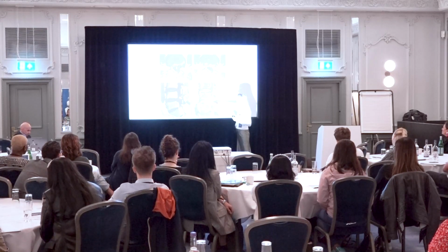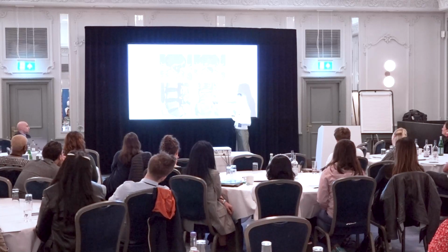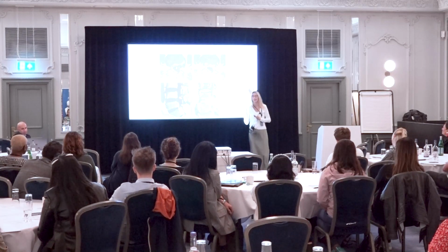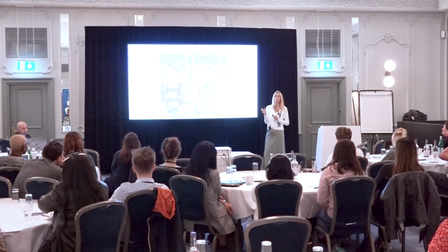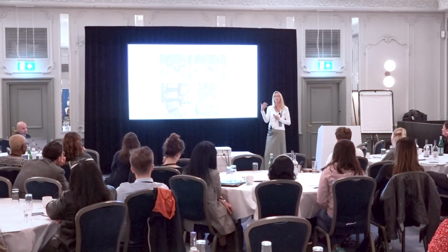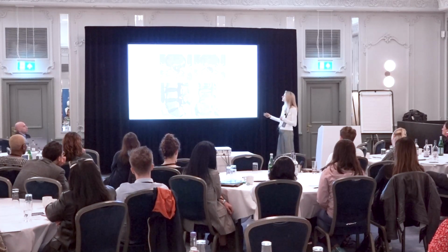So you get a little bit of enhancement of the nerve root and more enhancement here. Now this is a little recurrent disc fragment, but even when you don't have a recurrent disc fragment, if you have an enhancing nerve root, which is a little bit edematous and swollen after surgery, that can present as a neuropathy without any compression. So it's important to look for both factors.